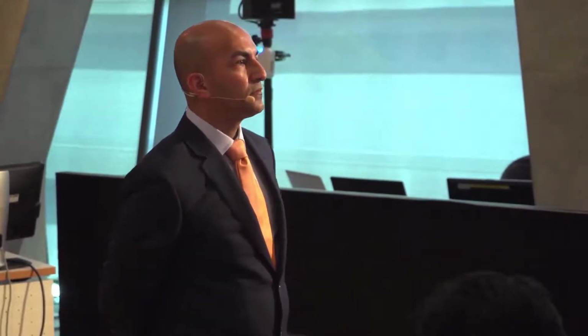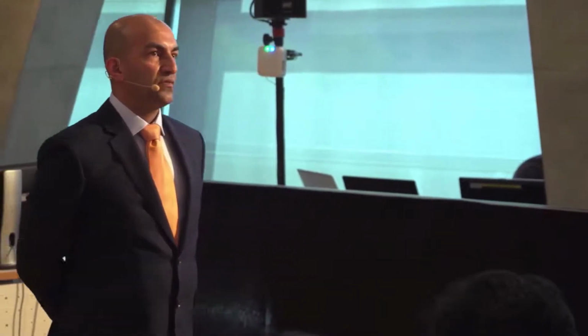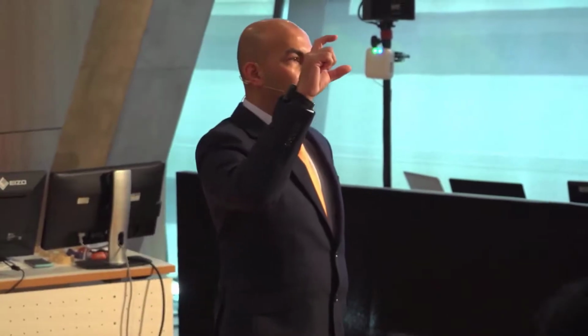How do you cope with altering the vertical dimension? You mentioned that your patients have to do a strong bite in order to have good contact points. And what else happens when there's a small change in the vertical? Do you mean a change in the vertical because the crown is too tall, or do you mean a change that you're purposely trying to bring in?